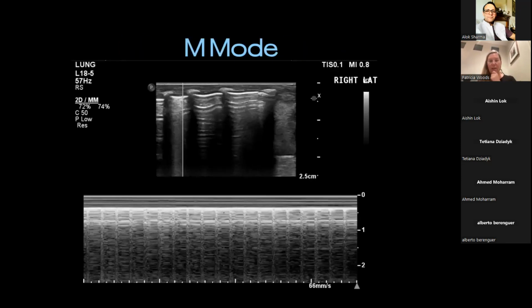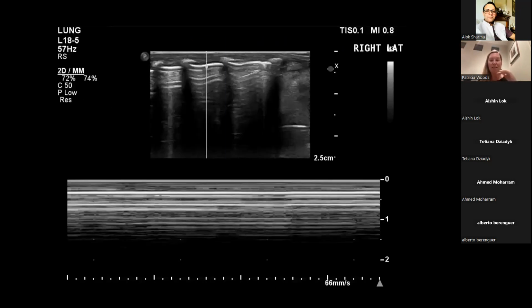Okay, and again, another region here. This is more of a lateral appearance. I know that because of the shape of the ribs and the sort of shape that you have, a nice 3 rib space, and then solid organs coming down inferiorly. But again, in that area where it's B lines, it's easy. Yeah, it's such a sharp contrast. Come to A lines, totally different. And that's just moving 1 rib space down now. There shouldn't be an explanation for that.